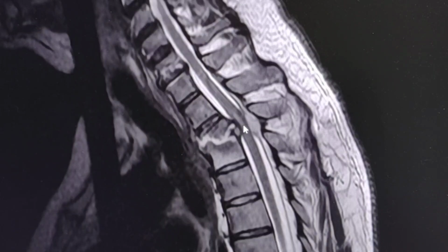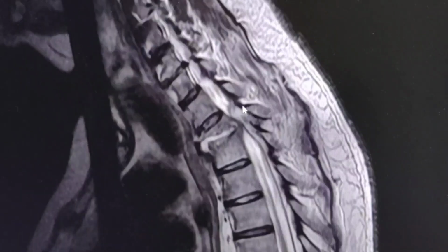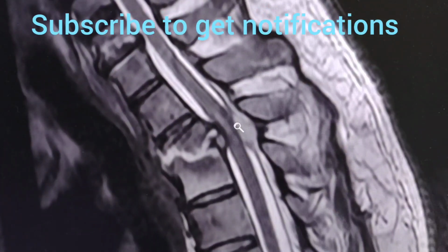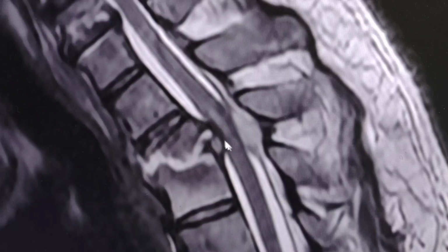There is significant spinal canal stenosis. There is this collection, an epidural collection abscess, and due to the significant impingement, as you can see, there is a focal abnormal signal intensity of the spinal cord.